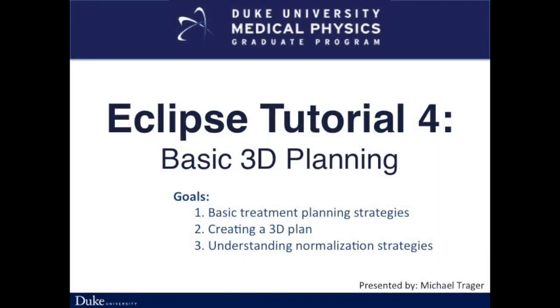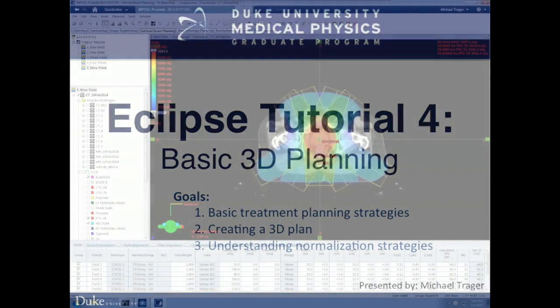This is the fourth video of the Eclipse tutorial series, Basic 3D Planning. In this video, I will discuss basic treatment planning strategies, an introduction to 3D treatment planning, how to include add-ons, how to calculate dose and modify beam weightings, and how to normalize the plan.